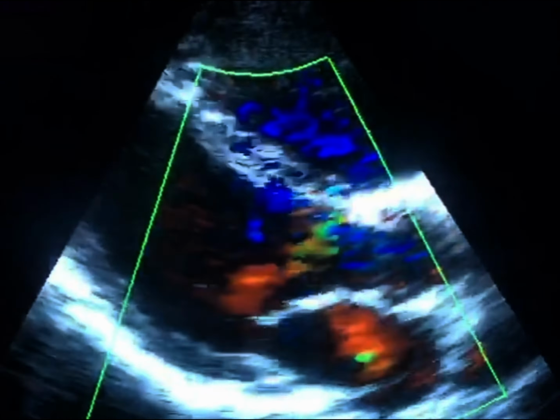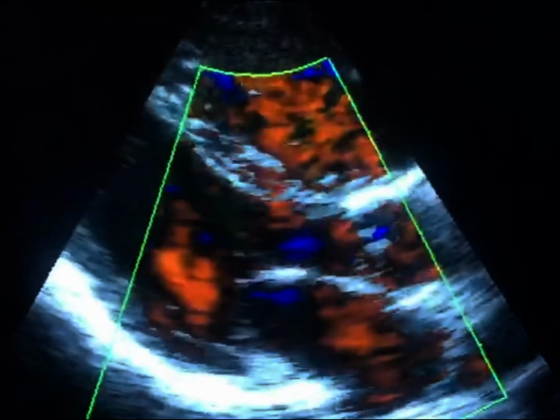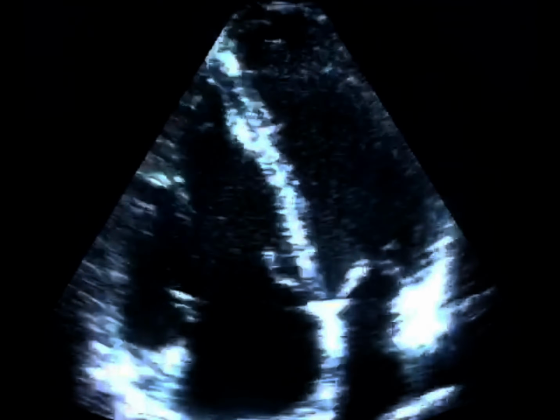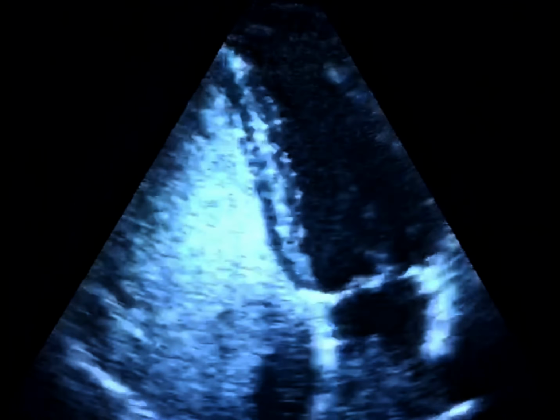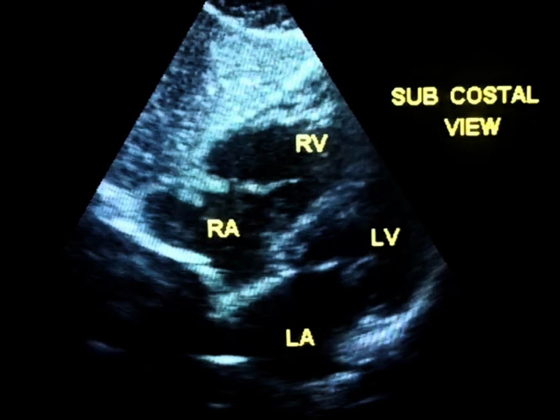The echocardiogram belongs to a patient with a systolic murmur. The four-chamber view indicates right ventricular enlargement. In the contrast study, many contrast bubbles appear in the left atrium, suggesting an atrial shunt.